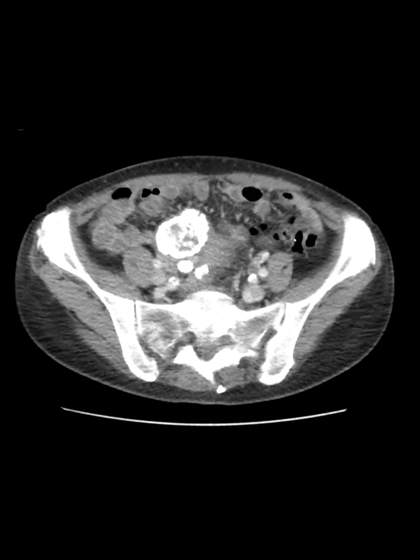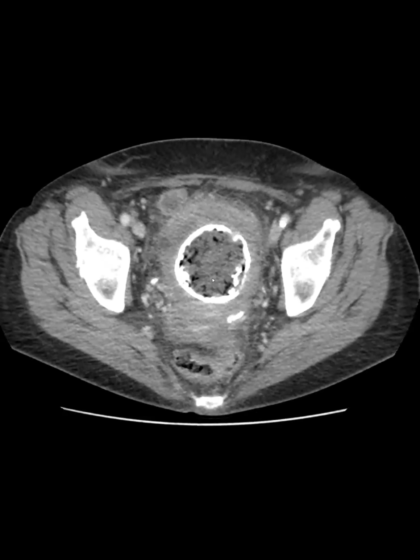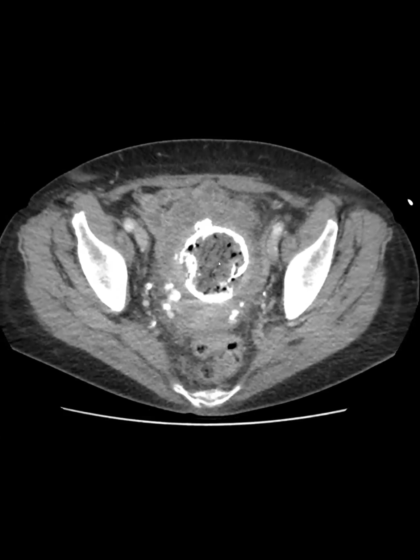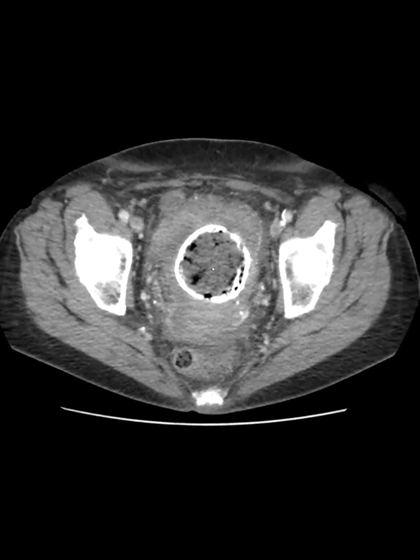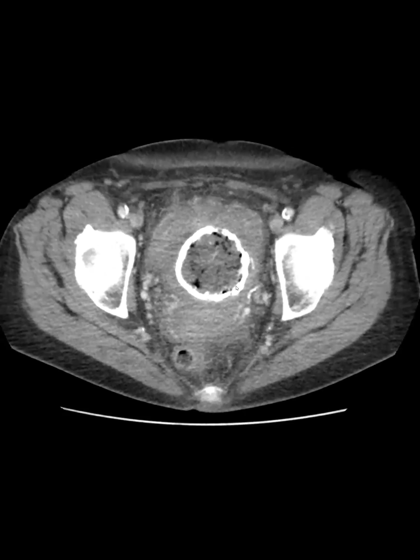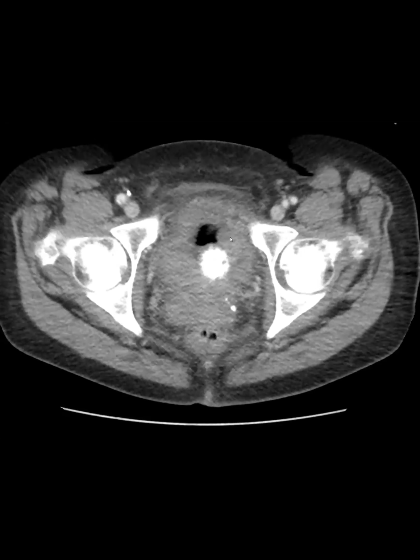So this is a patient post-UFE. You can see that they have these calcified fibroids. One of them has air in it, which is actually not that uncommon in the immediate or even long-term post-UFE phase. Usually it's from necrosis with nitrogen release. And you can see the bladder has some air in it. Bladder wall is a little thick.